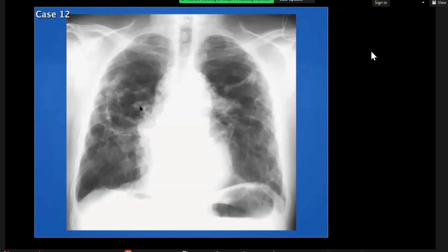Okay, so this is a frontal X-ray. There are some predominant changes in the peripheries of both midzones, with some coalescing nodularity and opacification extending up to the hilum. Again, the bases are largely spared. The apices are also clear. There is bilateral lymphadenopathy. So this would be in keeping probably with late stage sarcoid with some fibrosis along the margins of the peripheries in the midzones.